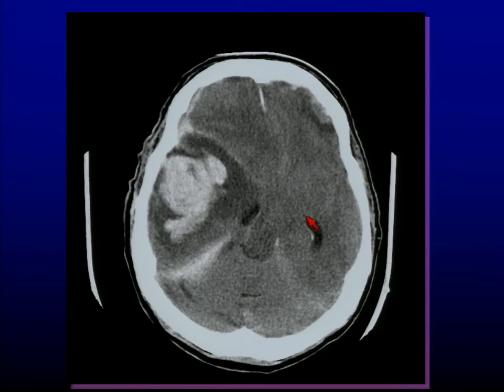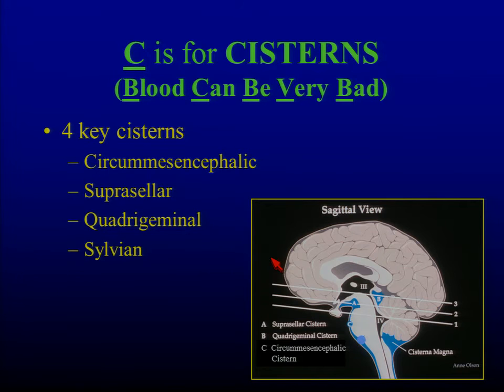What's it doing? Well, here's the left lateral ventricle. Unfortunately, here's the right lateral ventricle, which is now almost a midline structure. Here's that quadrigeminal cistern down here, which you see is kind of turning to the patient's left. The brainstem does not like to be turned in any particular direction. So this, I would imagine, this patient would be profoundly unresponsive because their brainstem is being twisted. It won't do that.